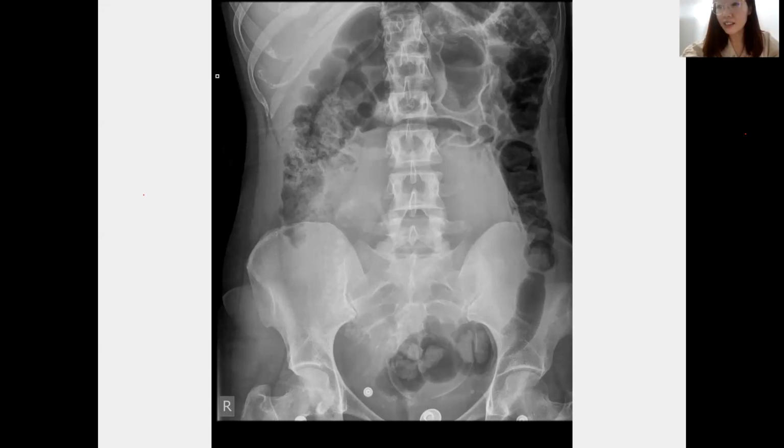Really, nobody? Okay, come on, one more guess. Somebody must know. Okay, let me give you a hint. An 18-year-old female with acute abdomen.